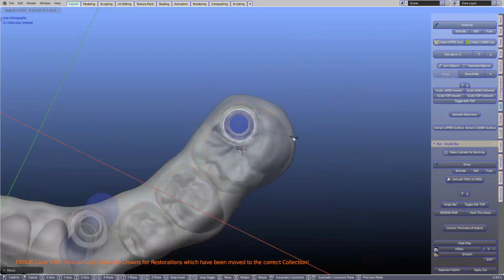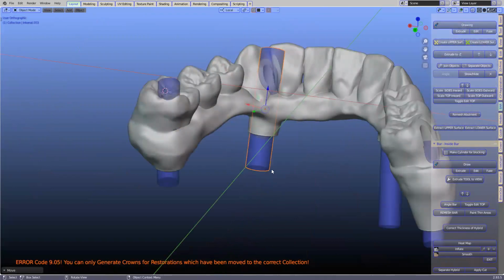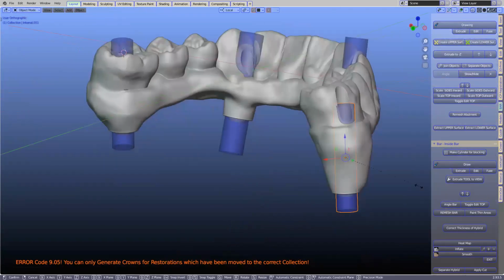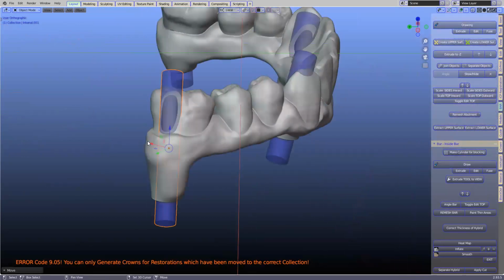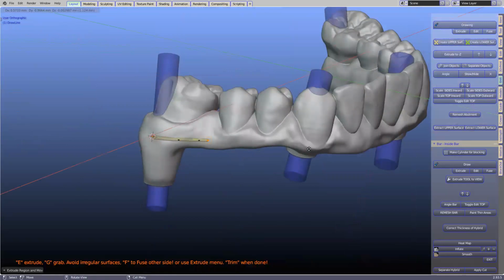Okay. Scale like that. All right. We'll just move these nicely into position like that. Wolfgang, I had this edit thing previously. Do you remember? Scale Z, fast edit to select the insides, but that just didn't seem to do the job that well. Okay, so again, we're going to draw, extrude all the way along here.